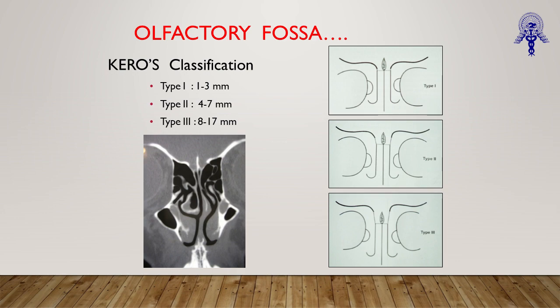But if you are working in a type 3 situation, the anterior ethmoidal cavity or ethmoidal sinus roof and this wall is actually very thin here, and a major part of this. So while a surgeon is doing the surgery with the forceps, you can easily go into the skull base while you are not poking here, you are just going paraseptally here. So that is important to understand, and that's why you need to see this also in the coronal scan.